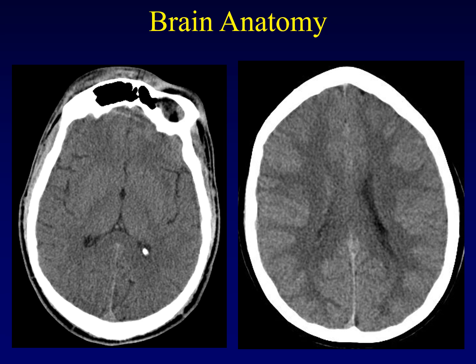Now normally, this is my favorite part of the lecture, where I put a red arrow on the slide and everyone in the audience shouts out what that arrow is pointing to anatomically. It's going to have to work a little differently now that we're doing this online, but we'll see if we can make it work. These are two transaxial images from a CT scan, this one a little lower down and this one a little more superior, both of them going through the brain. You'll notice that some basic concepts apply.